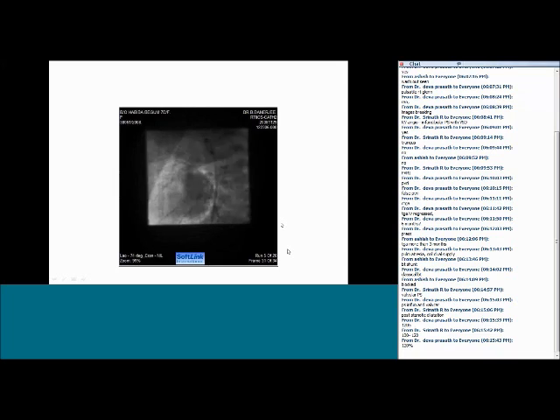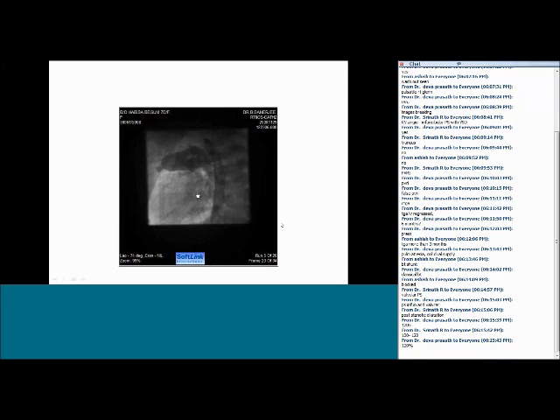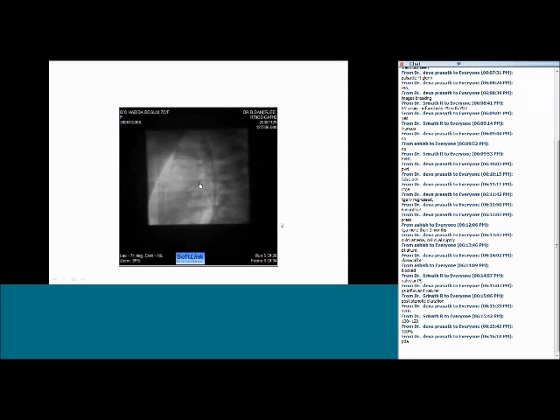Okay, diagnosis. This is a 7 days old child. That's not the correct full diagnosis, Prashant. You need to add something more. PDA is not the full diagnosis in this patient. That is a PDA, definitely there is a PDA.